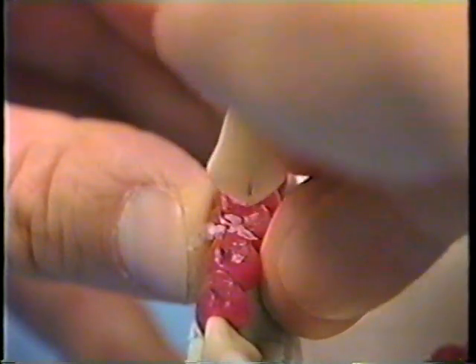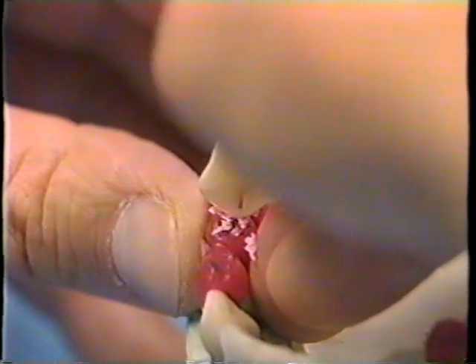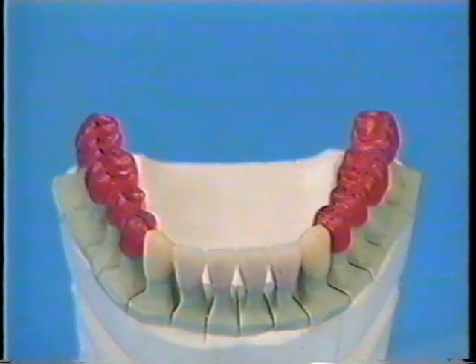Note that we can create a steeper groove below the deepest point of occlusion, since this region does not make contact with the antagonistic tooth. Our intention is simply to raise the mastication ratio while improving the spillway function.